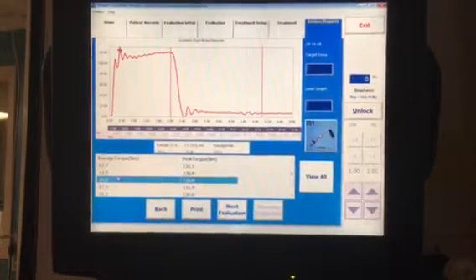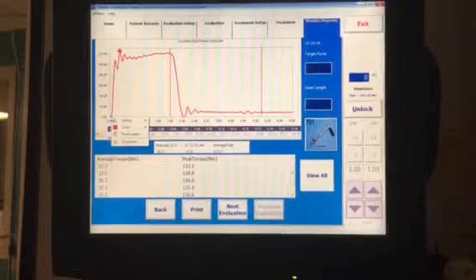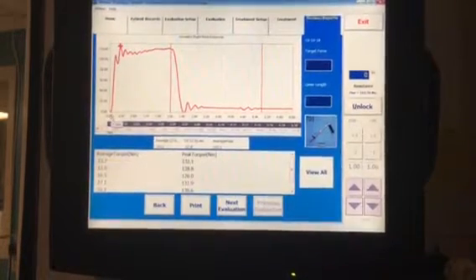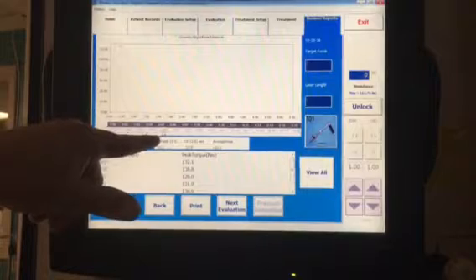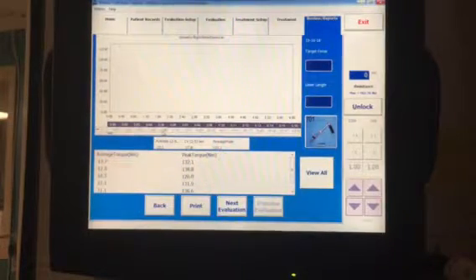I selected number 3 because that looked pretty good, and what I need to do is identify where the graph actually starts to accelerate or ascend. Because you didn't start right at 0, it's going to take a little bit of hunting and pecking. But if we see here, it's 0.38, so that's pretty darn close to 0.